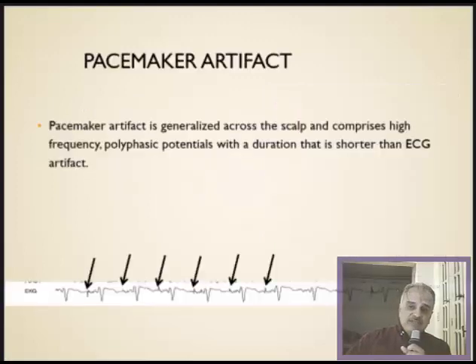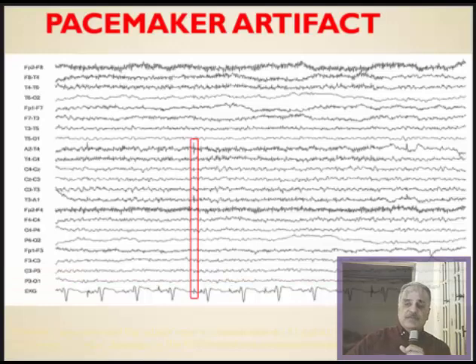The pacemaker waves are preceding the QRS complexes at fixed distances. They can also cause EEG artifacts, but at that moment they are very short-lived and polyphasic. Let us see an example. This is an example of pacemaker artifact, short-lived with polyphasic, matching that of the pacemaker on the EKG channel.